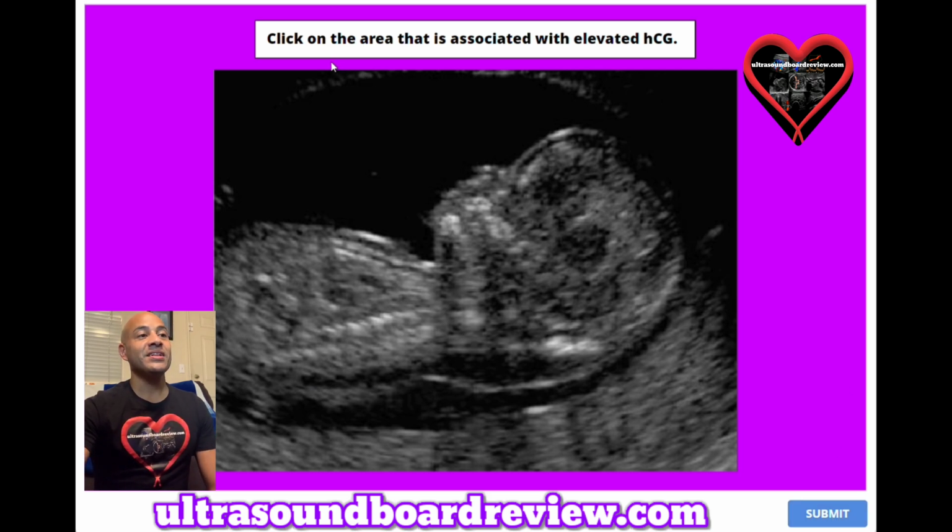Question 23. Click on the area that is associated with elevated HCG. The answer is right here with the increased nuchal thickening.